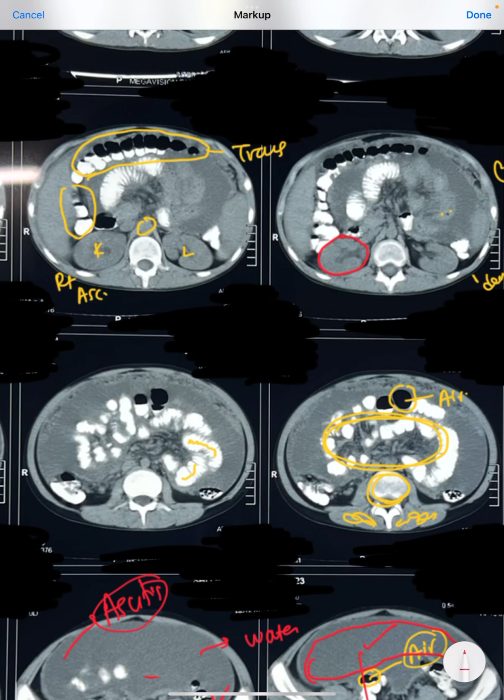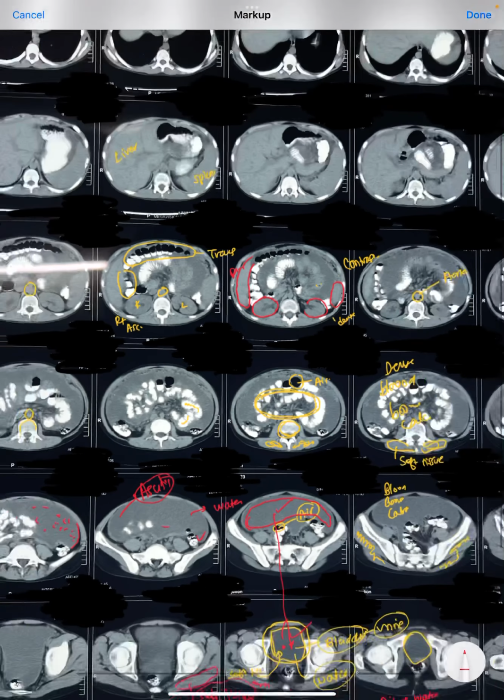It is very smooth. The left kidney is also very smooth. This is definitely the right side. So this is the liver, and here will be the spleen. We see that the liver is very well demarcated. The spleen is very well demarcated.